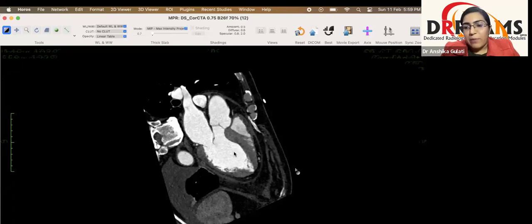This is known as fibrous aortomitral continuity, which is an identifier of the left ventricle. In cases of TGA, for example, if the pulmonary artery arises from the left ventricle, then we'll see a fibrous continuity between the mitral valve and the pulmonary valve. Remember, there is no conus in the left ventricle. There is no conus, there is fibrous continuity.